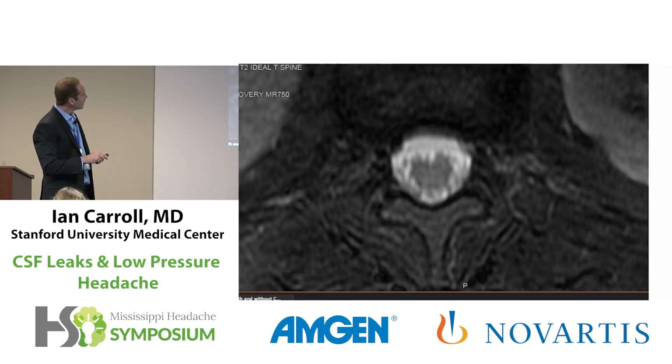Now, you could wonder, maybe this is a couple of millimeters below. Is there a little ventral fluid there? And is the dura right there? And then this, just a couple of millimeters away, but only a couple of slices, what looks like T2 hyperintensity fluid signal outside the dura.